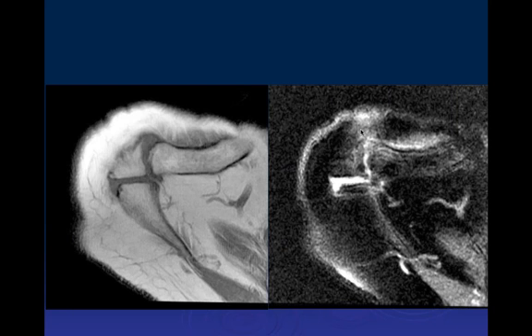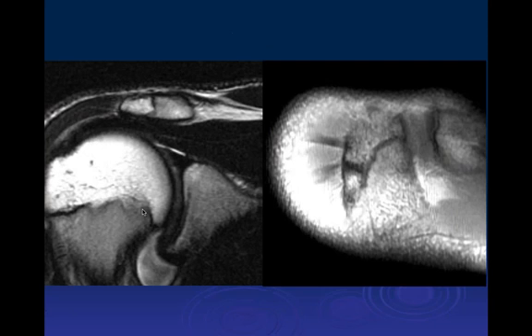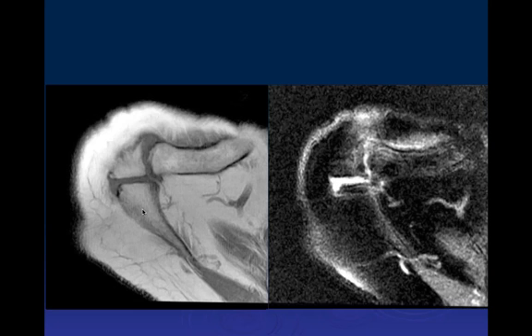Looks like we have an axial T1 and a PD fat set, and we have an osseous abnormality. A congenital variant is os acromiale, and there are, I guess, 3 types, and I'm not sure if it's a meso... or wait, okay. So this is an os acromiale. You've all seen them, especially in this location. They're really quite common.